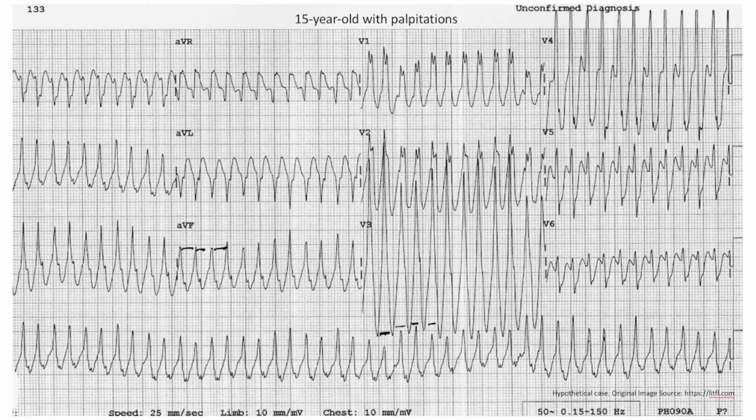And because you see a wide complex tachycardia, it means that when the conduction is going from the atria to the ventricles, it's not following the normal conduction pathway. The person either has ventricular tachycardia or WPW syndrome with a re-entry tachycardia that's traveling from the atria to the ventricles through the aberrant pathway and then circling back through the AV node. And that would explain why the QRS complexes are abnormal.